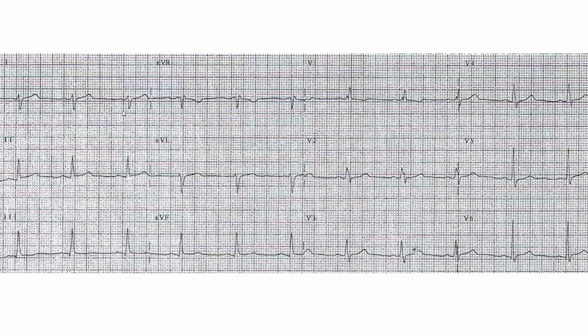So what you have on this EKG, you have right axis deviation, QRS negative in 1 and upright in aVF. And you have an upright R in V1 that is larger than S. Actually, there is monophasic R here. So the diagnosis is straightforward. This is right ventricular hypertrophy. And this patient's QRS is less than 110 milliseconds. So you don't have that dilemma of trying to diagnose RVH in the setting of right bundle branch block, which I'm going to explain shortly.